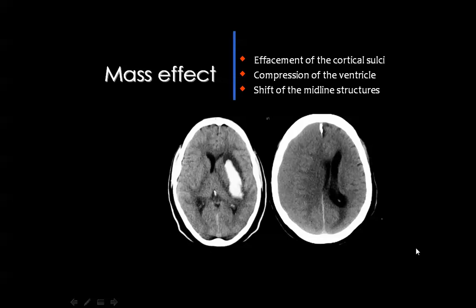Then, if there is an intracranial lesion and this lesion is sizable enough to produce what's known as mass effect, and this mass effect will be expressed in one of three or both the three items.